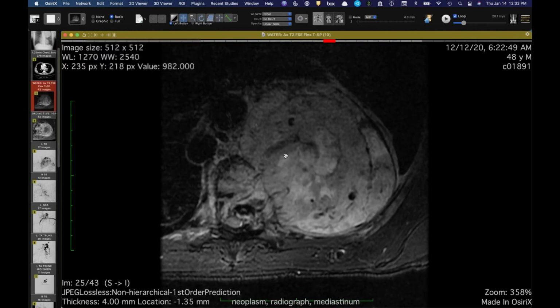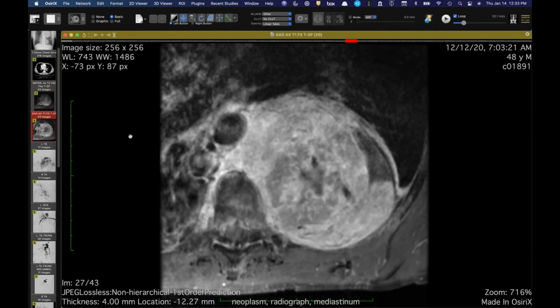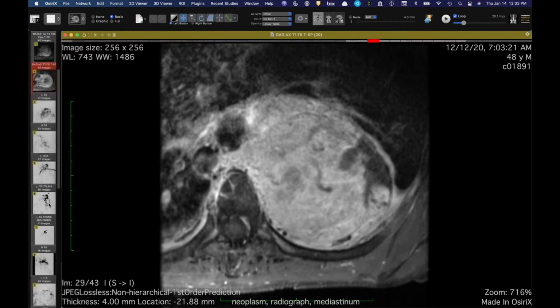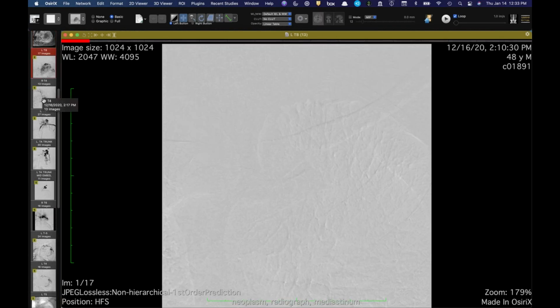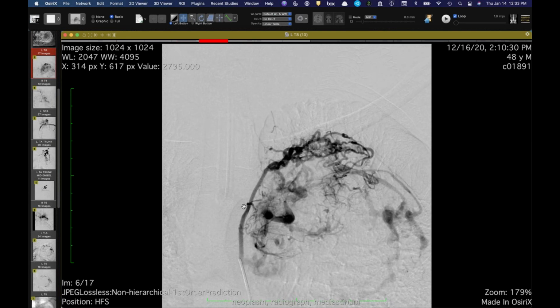I think I shared this briefly with Jeff and Howard just because I hadn't seen anything exactly like this. My first thoughts were some big sarcoma, maybe the world's largest paraganglioma that I've ever seen. And if he had had renal cell carcinoma, maybe a metastasis, which he didn't have. My differential kind of stopped at that point.